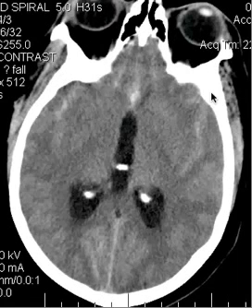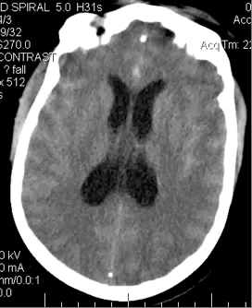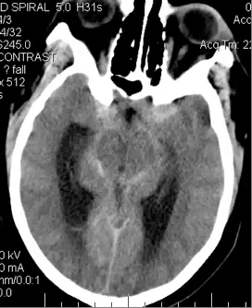You see blood in the subarachnoid space of the sylvian fissures bilaterally. Here you see a little bit creeping into one of the sulci in the inferior frontal lobe, and there's also some blood tracking in the interhemispheric fissure anteriorly. Okay, so that's all consistent with subarachnoid hemorrhage.